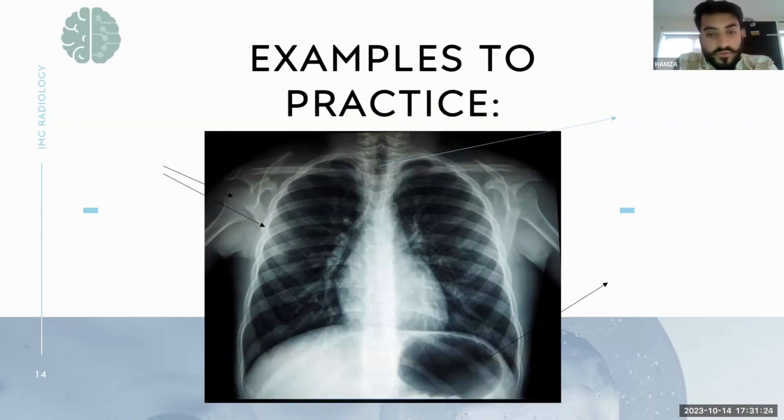Okay, good. Some people have already answered the question. That's the gastric bubble. These are examples where you have air present on your X-ray, and so they will present as black. As Dr. Tiju explained, the reason is that the X-rays are not being reflected or deflected; they are going straight through. But on the X-ray you also have things which actually hit your physical body and bounce off, as Dr. Karthik explained before. Examples are bones and tissues.